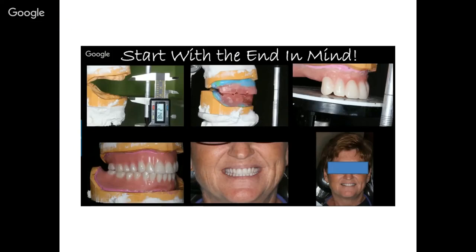Not in the too distant future, we're going to be releasing a denture module to the Blue Sky Plan software that's going to help with a lot of this functionality. But the denture needs to be created either physically by the lab or in the future by the software. We need to know the final ideal positioning of the teeth, and we can't develop a definitive treatment plan until we have that proper denture. Once we have the denture, then we can place the implants and know where the proper positioning and the proper treatment plan should look like.